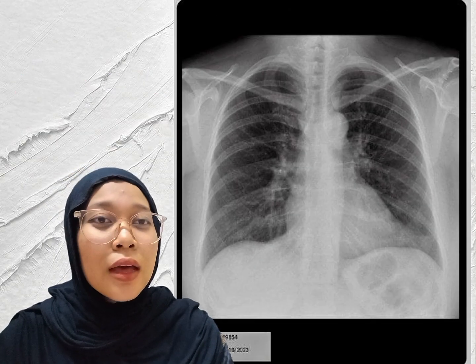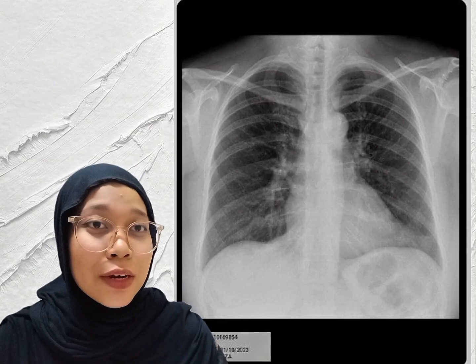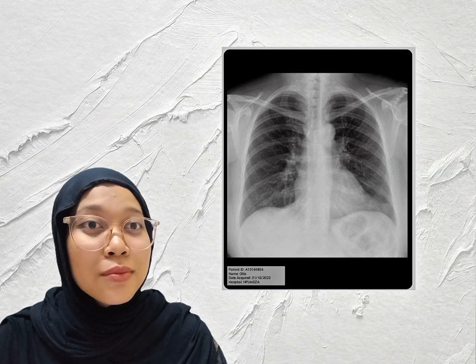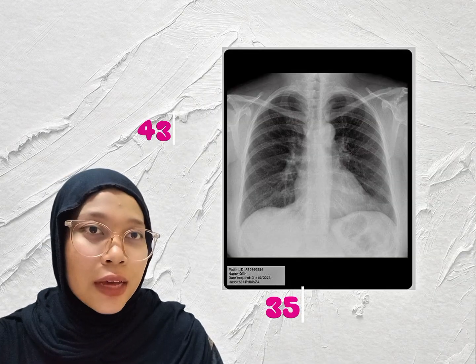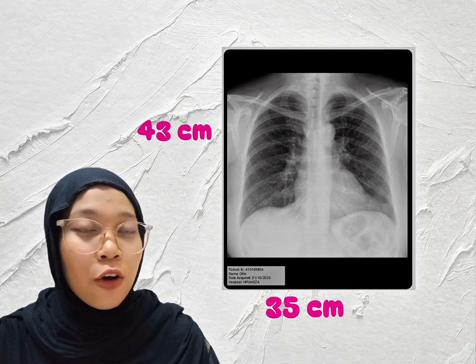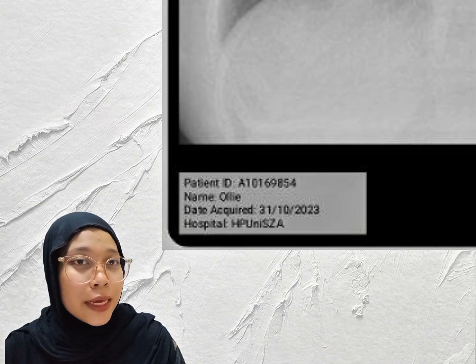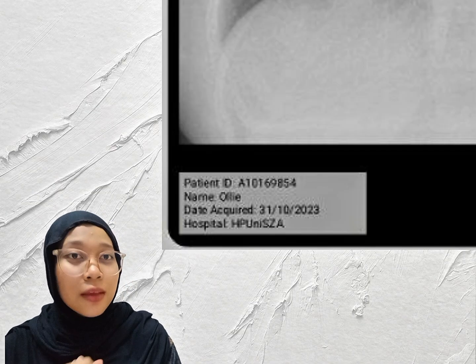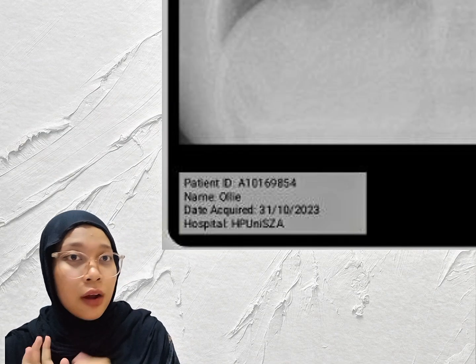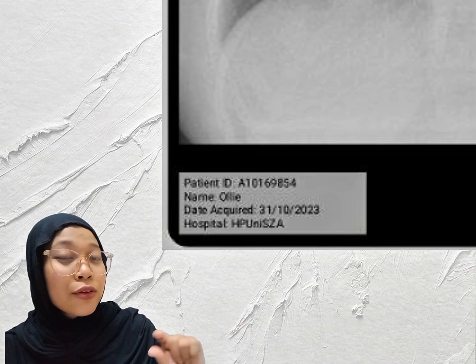For M, marker. There is no presence of radiographic marker shown in the radiograph. The marker should be placed above the level of the shoulder. For A, the film size is 35 times 43 cm, which is suitable for demonstrating the structure of interest. The last one, for name. Patient name and ID, date of examination and place of examination are present on the radiograph. The placement is also suitable, which is below the radiographic image.